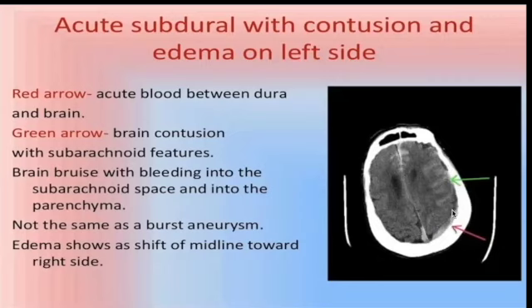So it makes no sense for a subdural hematoma or an epidural hematoma to be anywhere other than the periphery. So if you're looking for a blood collection, especially in the realms of subdural hematoma and epidural hematoma, then you're looking at the periphery. Except, like I would say the only exception in this case would be if you have a blood collection around the tentorium, especially in subdural hematoma. And again, you have something that looks like a fork at the posterior part. But other than that, if you're looking at a subdural or an epidural collection, you just look at the periphery for any abnormal whiteness, because that's how blood would appear at the periphery.